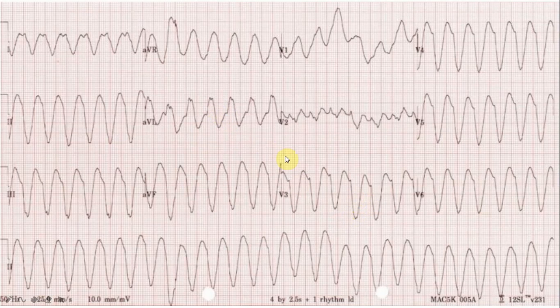Let's have a look at a 12-lead ECG to illustrate this a little better. Now in this particular ECG, we will look for criterion number 1 in V1, V2, V3, V4, V5 and V6. Now in V1 and V2 they are a bit dodgy looking waves. Let's look at V3, V4, V5 and V6.